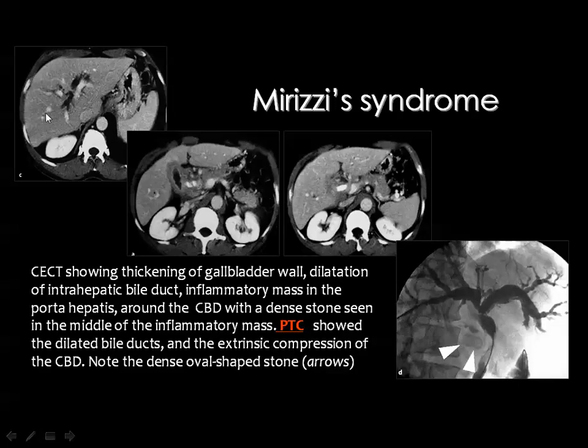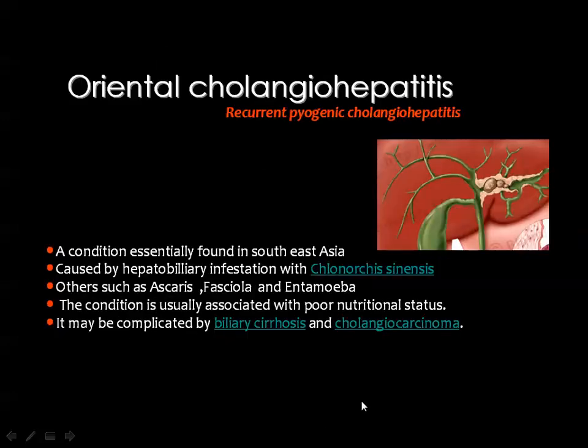Dilated intrahepatic biliary radicals, the gallbladder is chronically inflamed with thickened and enhanced wall. Then you see the stone in the region corresponding to the site of the common hepatic duct, and it is suspected to be surrounded by some inflammatory granulation tissue representing the cause of obstruction.